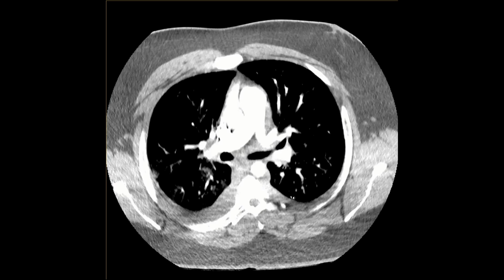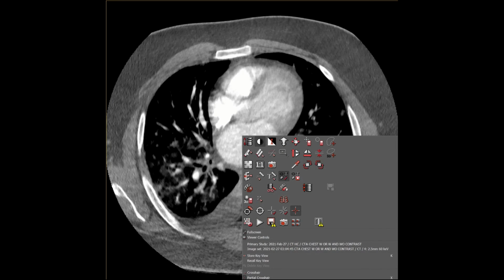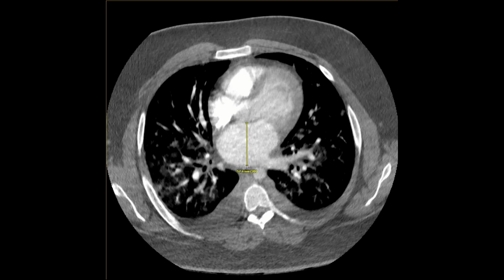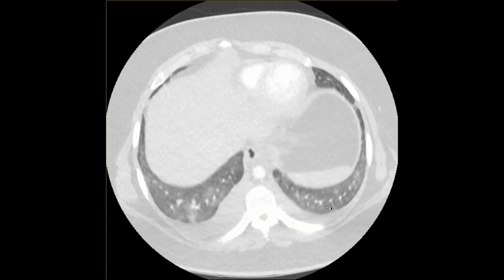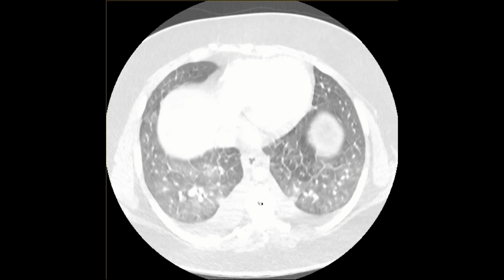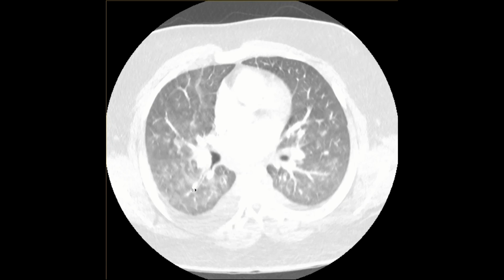And then we went to the CT. You can see the pleural effusions. You can see the big left atrium here. This is way too big for a left atrium. I'm going to measure front to back. I'm getting almost 6 centimeters. Normal is about 4.5 centimeters. And if we play with the windows and make it a lung window, you can see all the edema in the air spaces. Okay, so that's all I have for you today on this follow-up to heart failure.